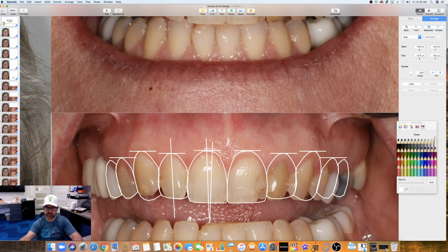We're just going to flip it, so now we have the same angle and symmetry of that tooth with both centrals. Copy paste that, flip that, and again now you can correct the symmetry or inclination there. We're going to paste that and put this there, and you'll notice again we're right about there, and this is more ideal inclination of teeth.